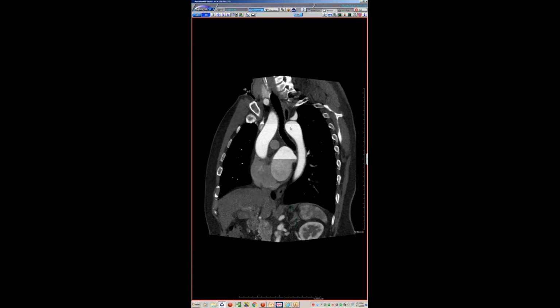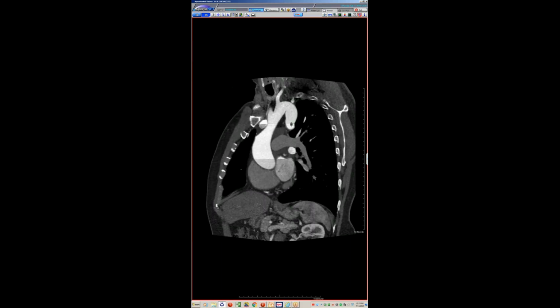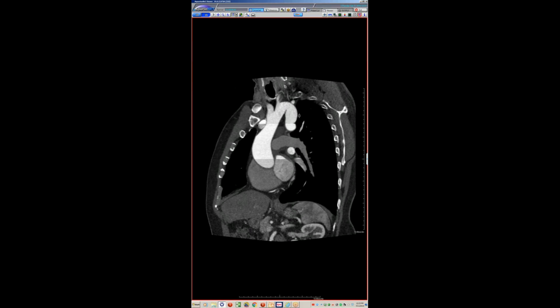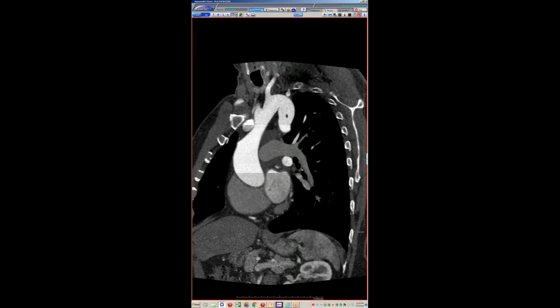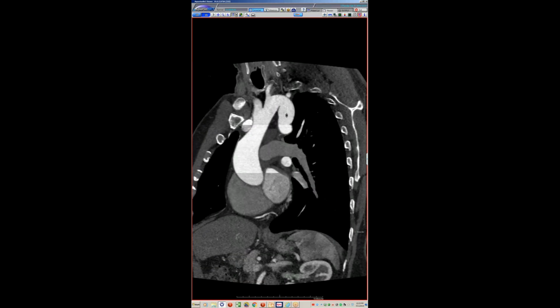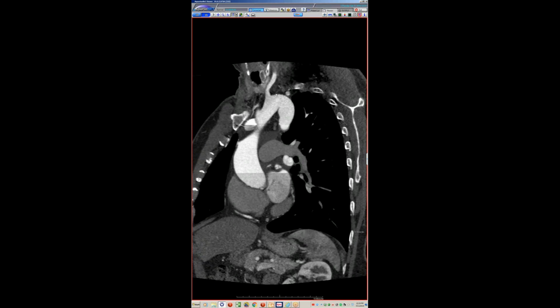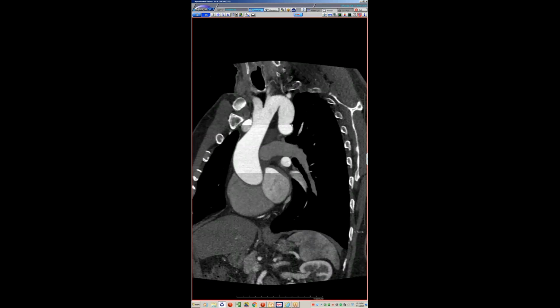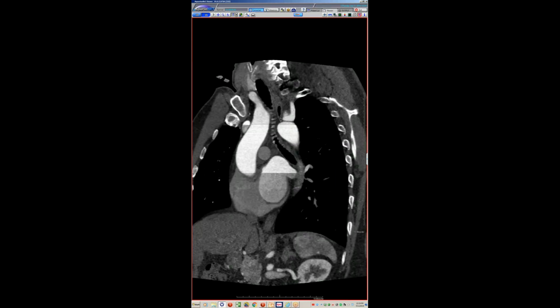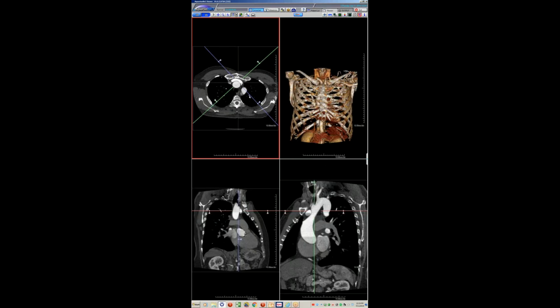There's no coarctation. In coarctation there's ductal tissue, or presumed to be ductal tissue, that wraps around the aorta in the ductal region that causes, when it contracts, coarctation. This is actually an embryologic overgrowth. I'm not sure of the underlying embryology, but basically the aorta between the left common carotid and left subclavian artery becomes very, very elongated and has nowhere to go. And you basically get this folding over of the aorta.